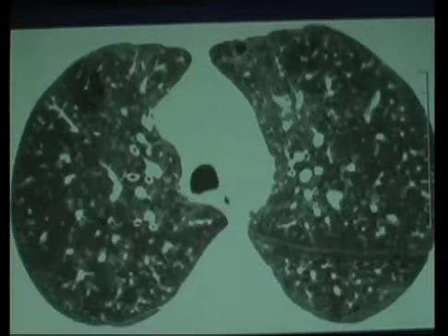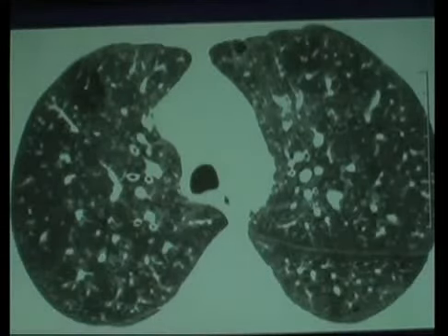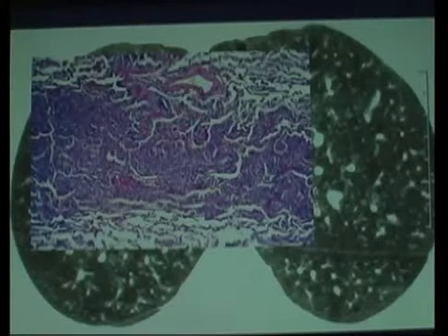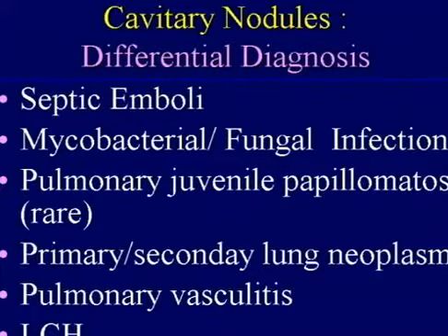Here actually making a distinction between kind of patchy ground glass attenuation and nodules really is pretty subtle, because when you get to the point where you no longer just have disease in the bronchioles, you're really talking about a more diffuse pattern, and you're not going to know what this is, so you're going to end up biopsying them. But the truth of the matter is, again, it's a rare entity in my experience. So this is what it looks like when you see it more diffuse.